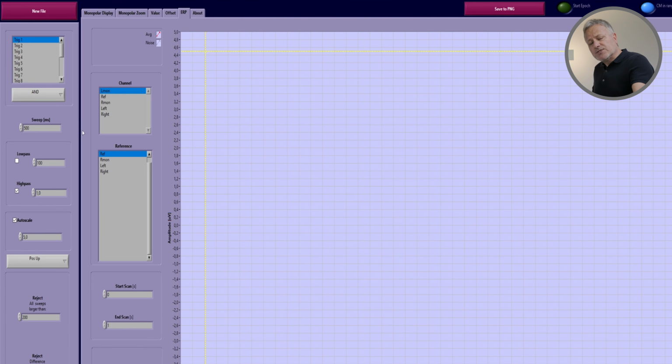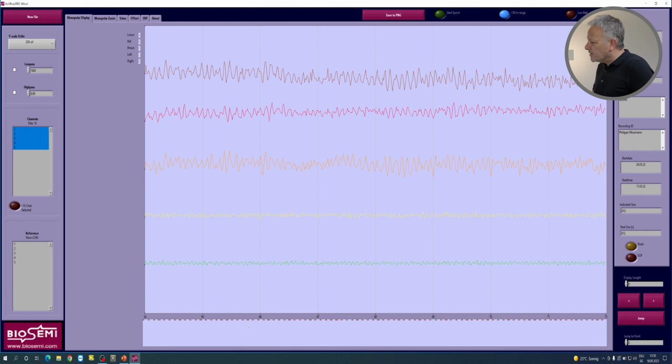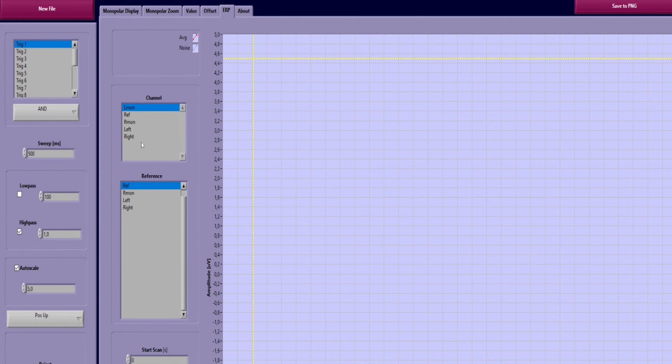Remember, the trigger we supplied was a 5 volt TTL trigger on the first input of the USB receiver. That's a 5 volt trigger. Not one-shot triggering, it's a 5 volt USB receiver trigger input on trigger 1. Not 2, not 3, on 1. Because remember, when we look at the screen here, we can see the brown little dots. That shows they came in on line number 1.